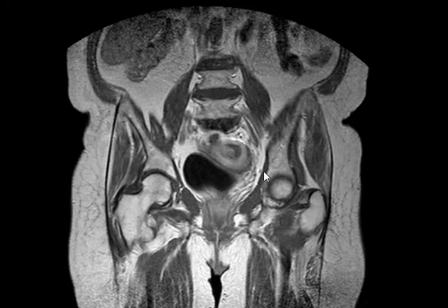What do you give this for staging? Stage one. It's invading the junctional zone, but not the perimetrium. T2 or T3 I mean. It's not invading the surrounding. She will benefit from hysterectomy if she does it.